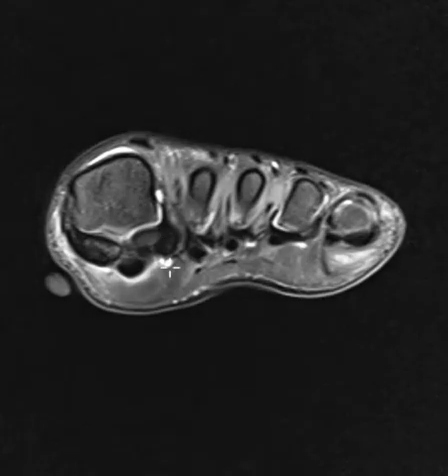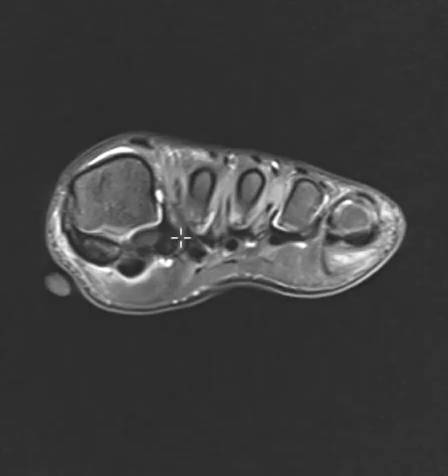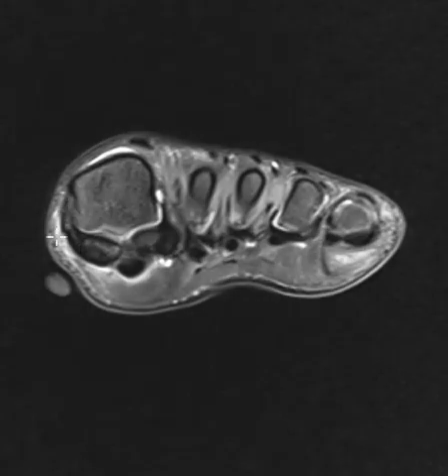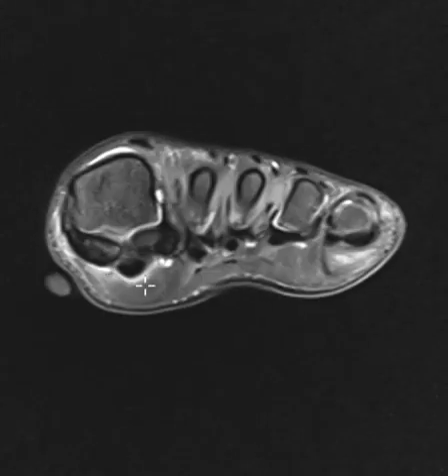Again, the lateral sesamoid looks great. And the next thing we want to look for is the plantar plate to make sure they don't have a turf toe or associated injury. They do have some edema going along the medial and plantar side of the first metatarsal associated with that recent injury. And now we're going to just look at the anatomy here.